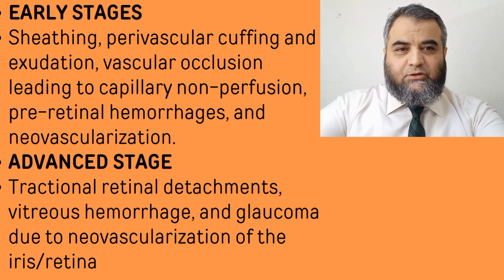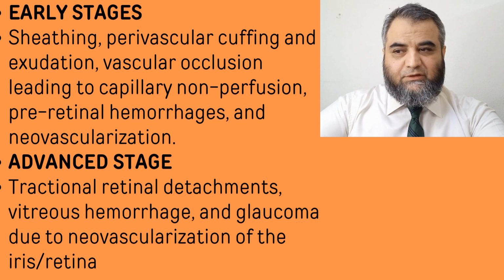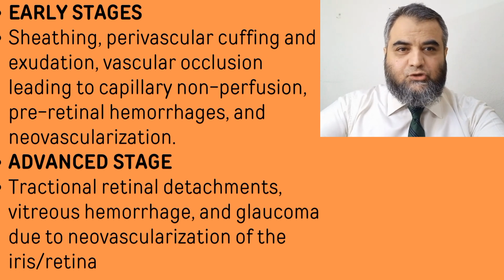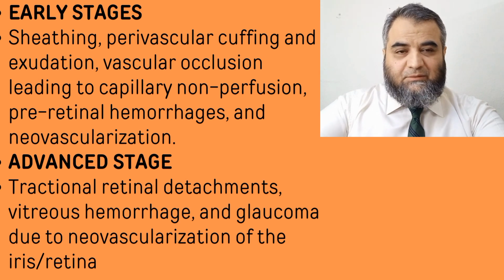In the early stages, you will see perivascular sheathing, cuffing of the vessels, and some exudation, occlusion, and capillary non-perfusion, capillary dropouts, especially as I show you in the left eye. This is not that much advanced yet. So these are the elements, and new vascularization occurs.